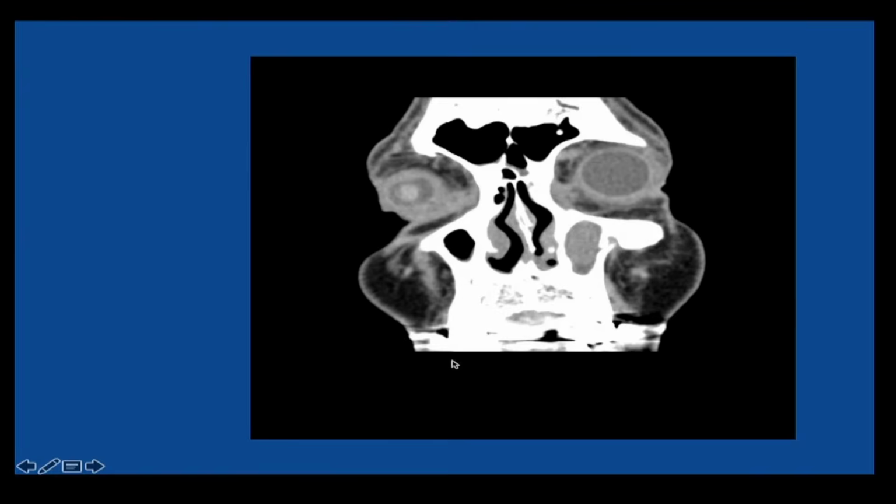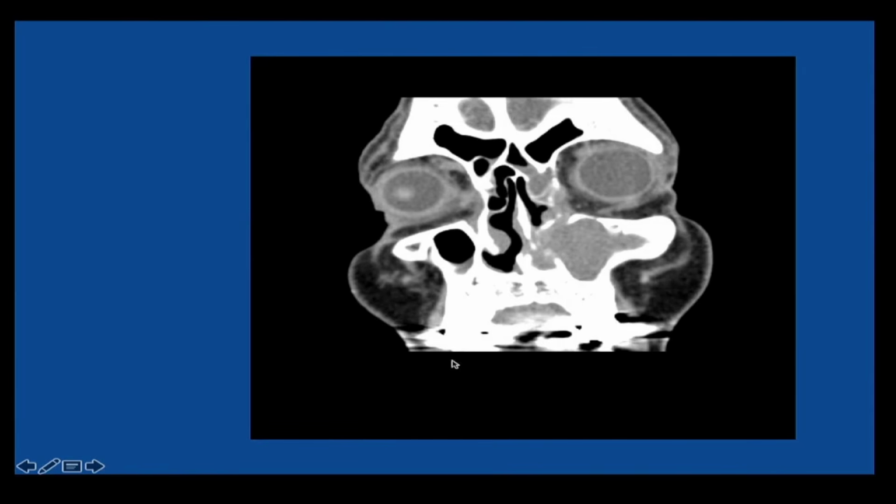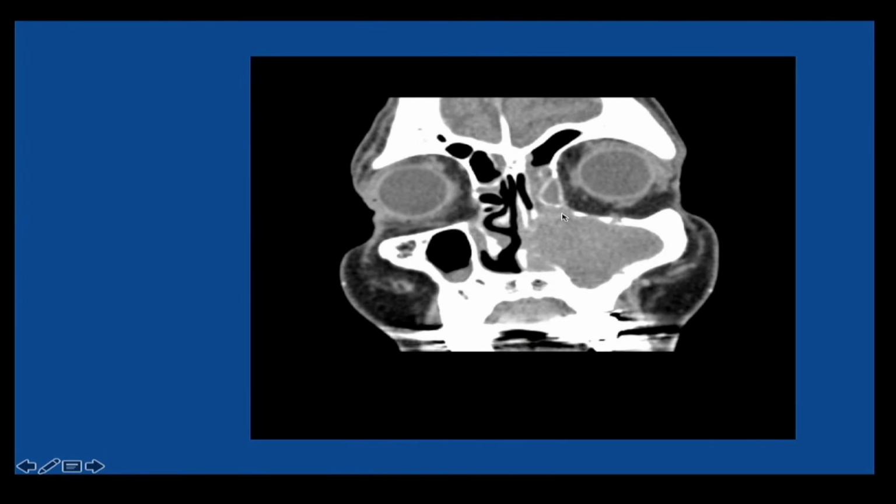So the same case for your benefit. There is some kind of erosion, or this is the area of your nasolacrimal duct.